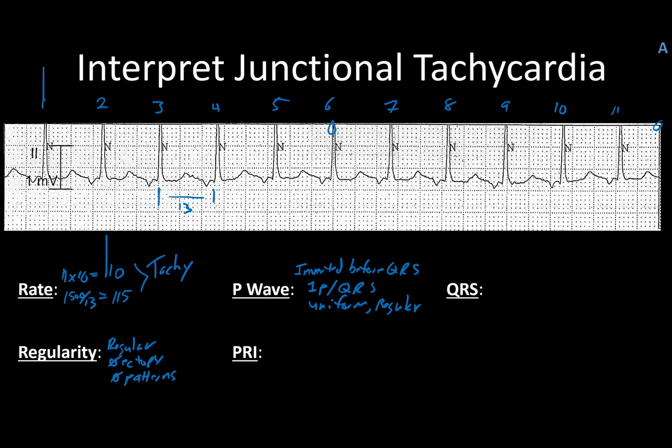So now let's go through and figure out what the QRS may be. Or sorry, not the QRS, the PRI. Got ahead of myself a little bit. So we'll start with beat number 5. Let's see what we can find here. This one stops right here. I'll say it starts probably about right here or so. It's a little difficult to tell. That's 2.5. Let's try another one just to be sure. Next one over starts about right there, ends about right there. 2.5.